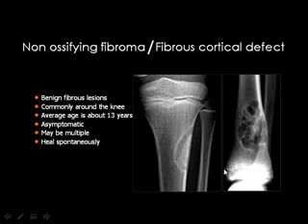But actually, the books usually write the diagnosis like this: non-ossifying fibroma, fibrous cortical bone defect, because both are intimately related, and sometimes you cannot discriminate both lesions on the basis of radiology. I assume that whenever the lesion is like this one with no deformity of the bone, you may assume this is a fibrous cortical bone defect.